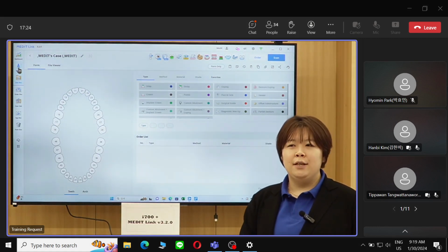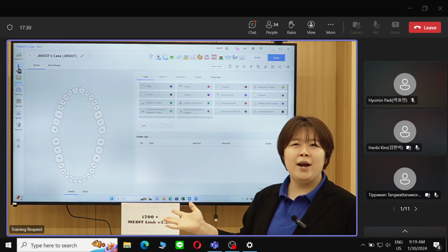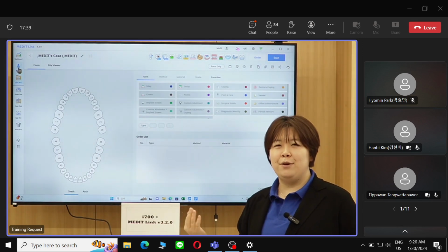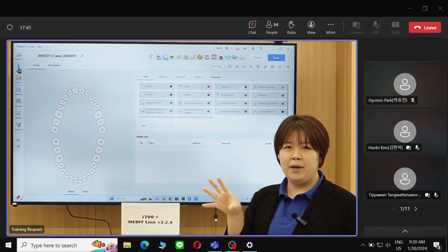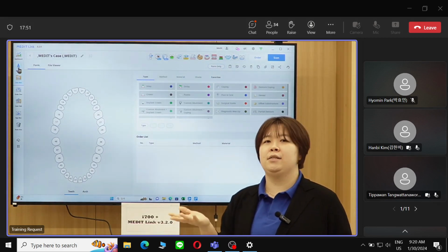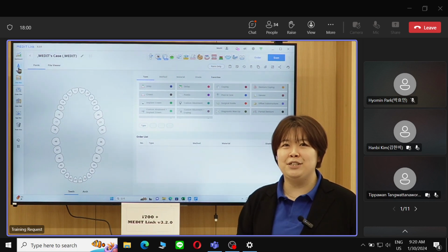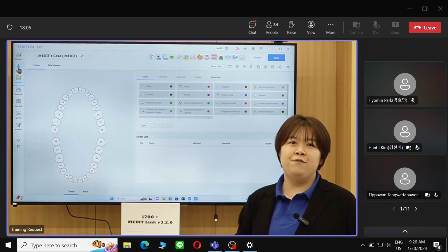Also, with those competitor IOS brands, sometimes they say our metal scanning is great, and when you scan with their scanners, it looks like the scanning is right. But actually, that could also not be quite true, because after processing, if you zoom into their data, you would be able to see that it's quite rough and uneven, which means that in many cases it might not be fit for prosthesis. And of course, we want to remember that the whole point of intraoral scanning is not just to get pretty images, but to get data that will serve for prosthesis fabrication.